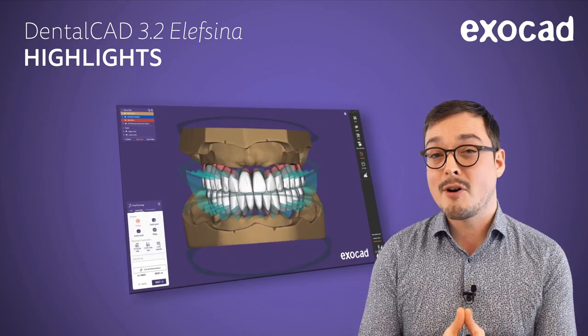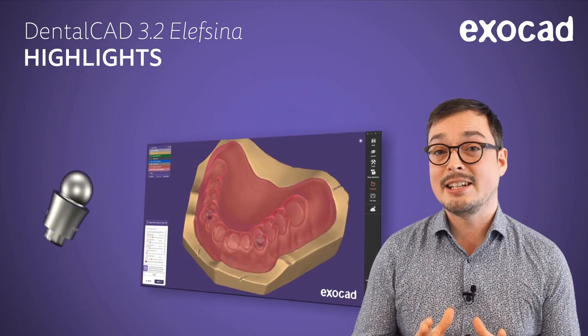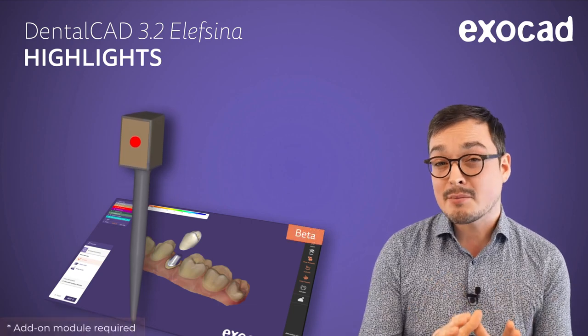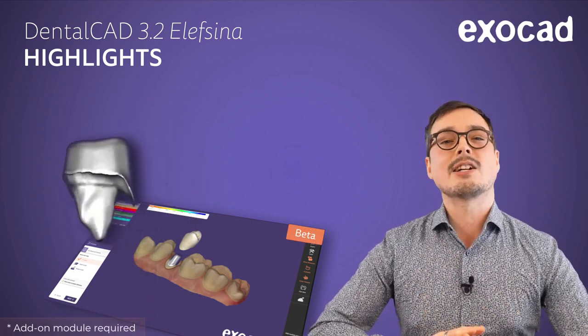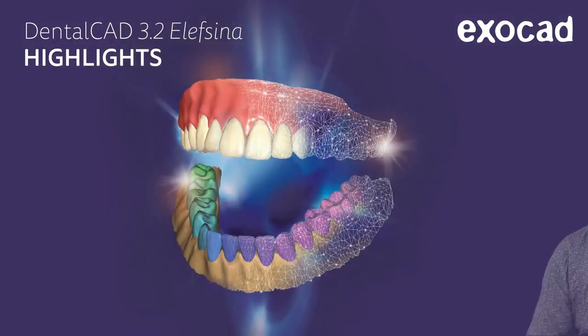Make use of the iVotion's denture system add-on that's now available for all our resellers. Let's not forget the ability to now design dentures on ball attachments. Plus, post and core restorations can be designed and provided with a matching crown designed in the same step. And there is so much more. Let's explore the new features together in the next few minutes.